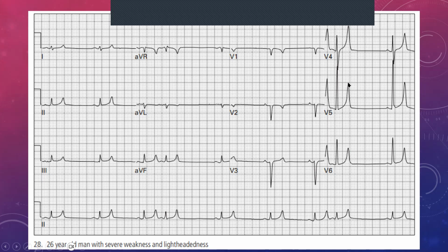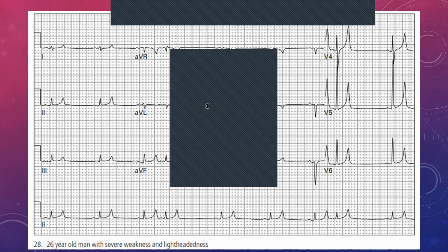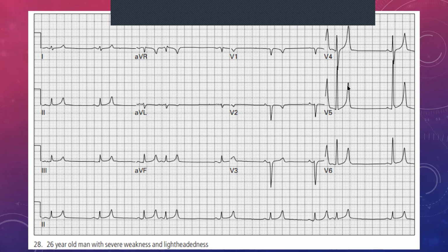So when you have these very, oh, there we go. Let's see. Ah, very good. Very, very good. That's excellent. So it is hyperkalemia. So Wadia, you've been following my lectures for a long time, and you definitely got that 100% right. That I'm very proud of because it's one of the things I've been teaching over the years. So very tall, pointed T waves that look like they would be difficult or very painful to sit on are quite indicative of hyperkalemia. And we're going to talk about that a little bit more.